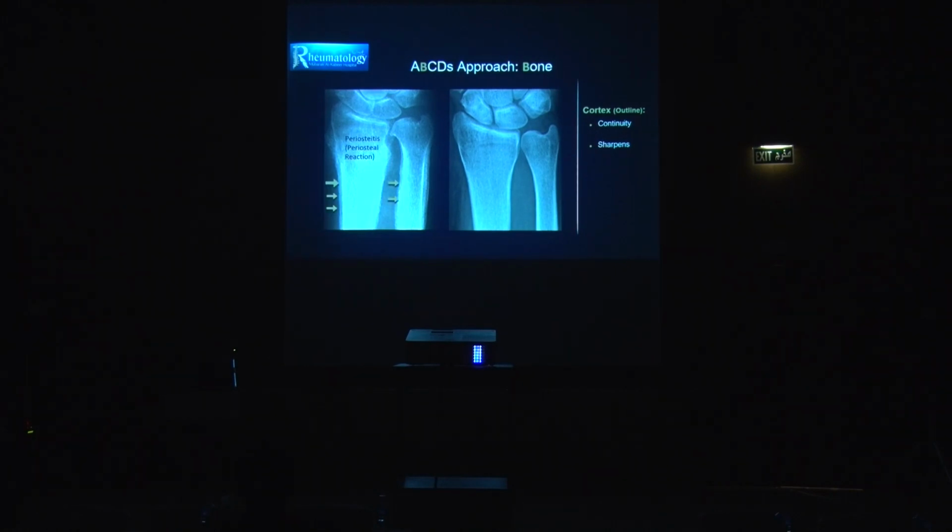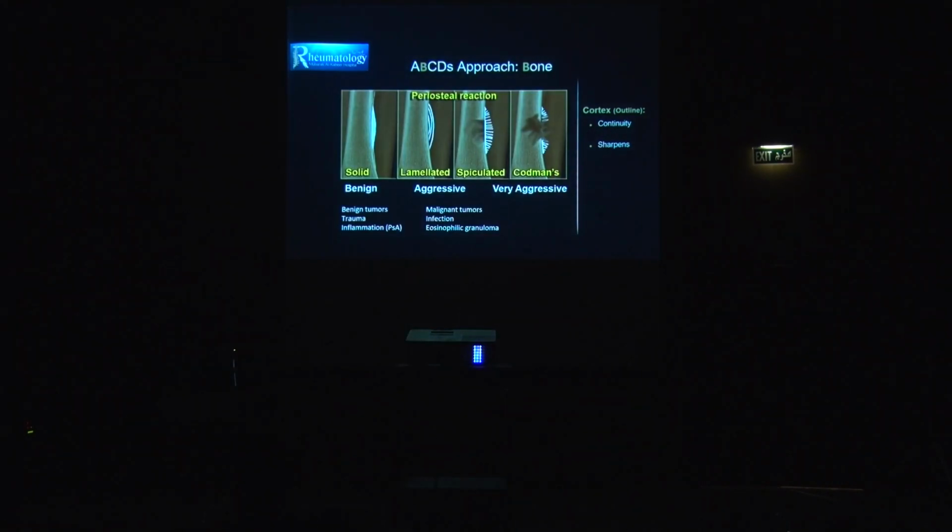Right, so this is called periosteal reaction. And what actually is periosteal reaction? The periosteum of the bone, when it's irritated for any reason, for example infection, trauma, inflammation, post-operative, or any sort of stress in that area, is going to be irritated. And when the periosteum is irritated, it produces bone. So there is new bone formed on top of the bone that's already there.